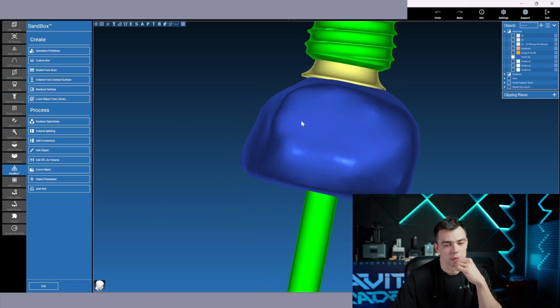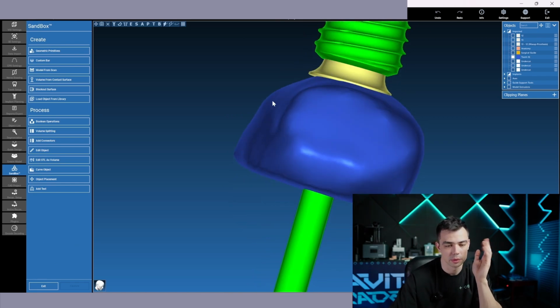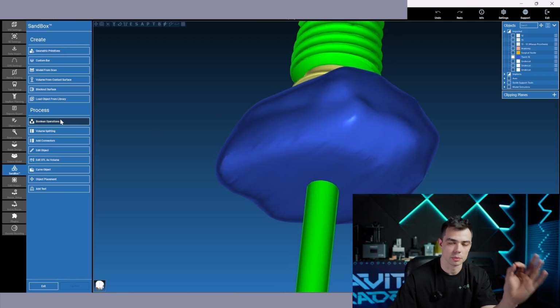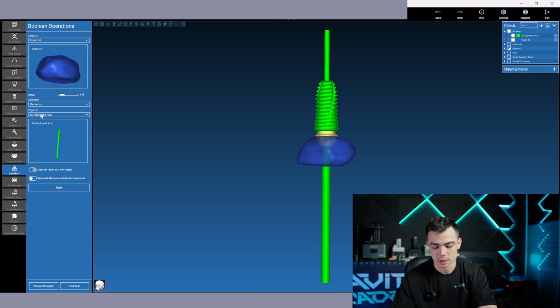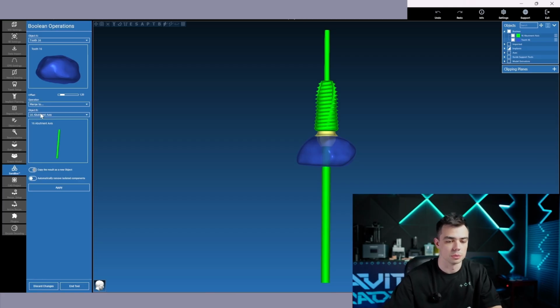and the second reason why you have to choose this abutment is because we will use a process called Boolean operation, and here is the file called abutment axis. This abutment axis is like a straight line we are going to subtract from tooth 1.6, and as a matter of fact the sequence of the files is important here.